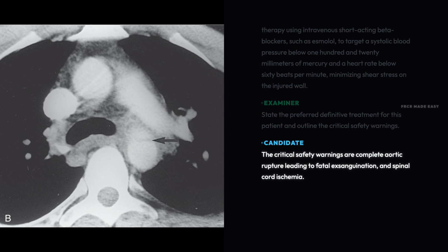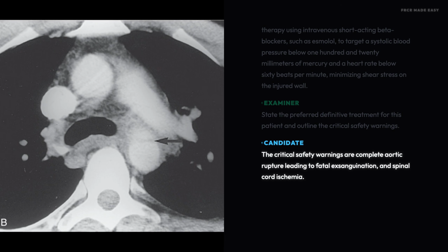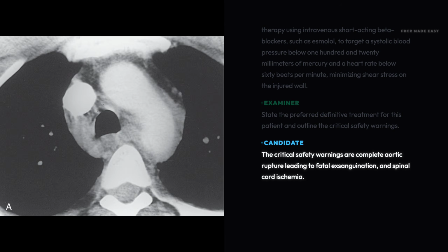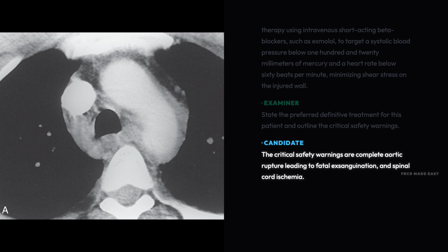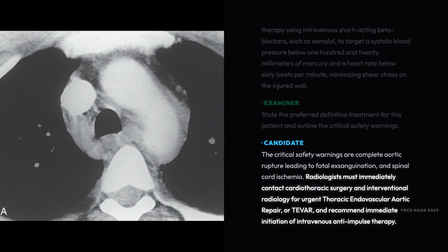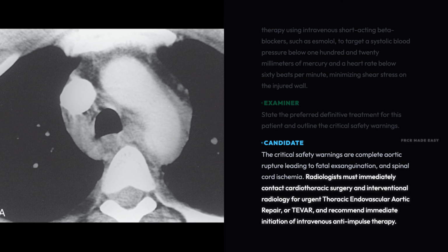The critical safety warnings are complete aortic rupture leading to fatal exsanguination and spinal cord ischemia. Radiologists must immediately contact cardiothoracic surgery and interventional radiology for urgent thoracic endovascular aortic repair, or TEVAR, and recommend immediate initiation of intravenous anti-impulse therapy.